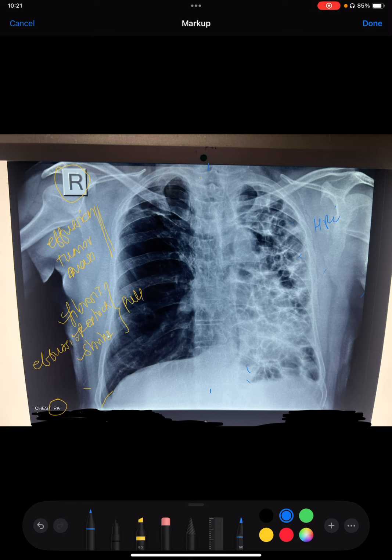But on this, what we can understand is there is significant loss of lung parenchyma on the left side, causing left-sided significant restrictive lung disease, fibrosis, causing pulling of the trachea towards the ipsilateral left side, which actually causes compensatory emphysema of the right side. That is the reason why there is over expansion of the right side of the lung to compensate for oxygenation.